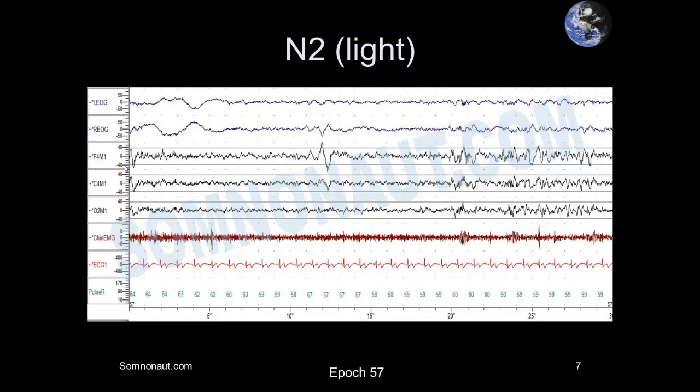Now I know through my experience that this is the way the K complex waveform would appear during the night in the typical negative up, positive down scenario for a channel. So even though this says negative is down, I'm leaving this in this display setting because this is the way I feel this waveform should be depicted.